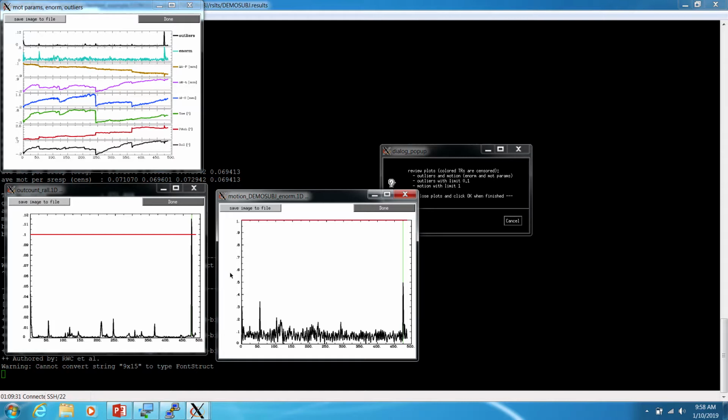So this is the graph of our motion, and here you can see the green line really clearly. This red line is our cutoff, and actually here we didn't get so much motion throughout. We got a little signal spike over here, and that's represented in green in this graph. And you'll see, hey, while it wasn't above cutoff, there was a lot of motion right at the same moment.